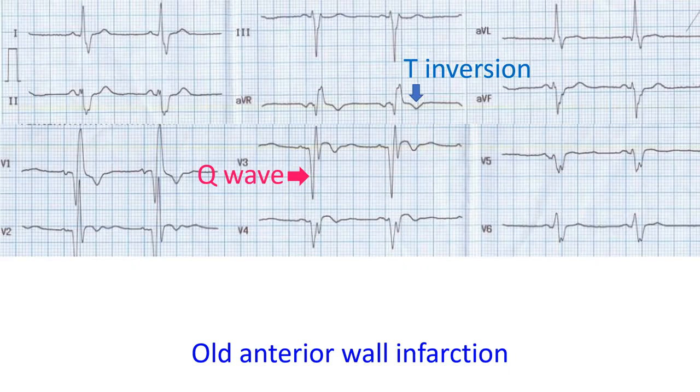Abnormal Q waves appear, indicating loss of electrical activity of heart muscle in that region, often called an electrical window. Q waves are the reflection of unopposed electrical activity from the opposite wall of the ventricle. Q wave is an initial negative deflection of the QRS complex.